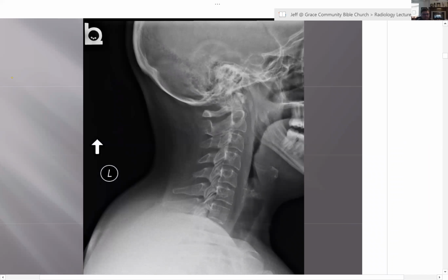All right, so detection, I'll tell you what, this is the kind of thing that if I could wire over a $10 gift to you for an award for making the finding, you would win something here. But just for fun, let's see if anybody can make the finding here. Go ahead and look. Technical, alignment, bone, cartilage, soft tissues. Don't get search satisfaction. Look at all four corners of the film. Anybody have a guess for me?